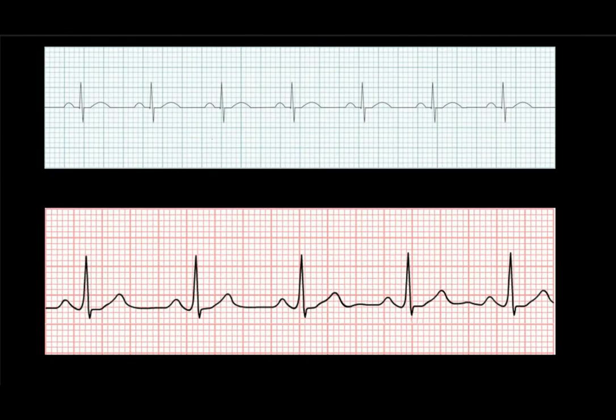Are P waves present or absent? There's no maybe. It's either yes or no. Either they're present or they're absent. And if they are present, are they regular or irregular? Now we'll get back into a little bit of that. Is it regularly irregular, irregularly irregular, or occasionally irregular, once we look at some of those areas, and we can help identify what I mean by that.